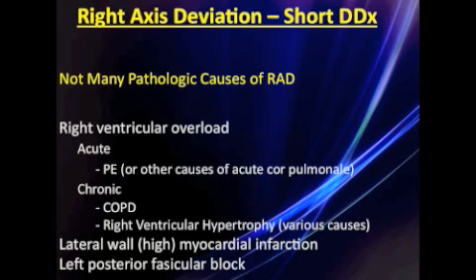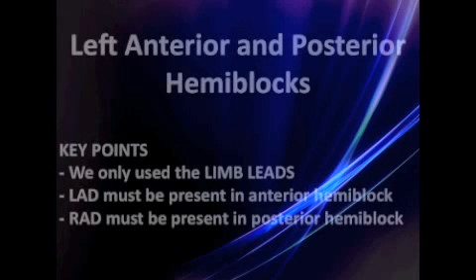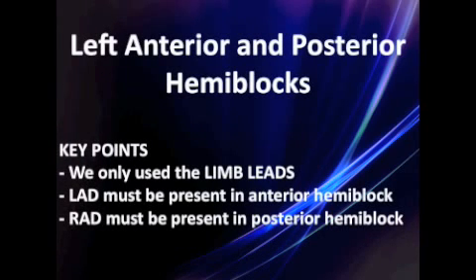So key points, left anterior and posterior hemiblocks can be diagnosed pretty easily using EKG tracings. You only have to look at the limb leads. LAD must be present for an anterior hemiblock. RAD must be present for a posterior hemiblock.